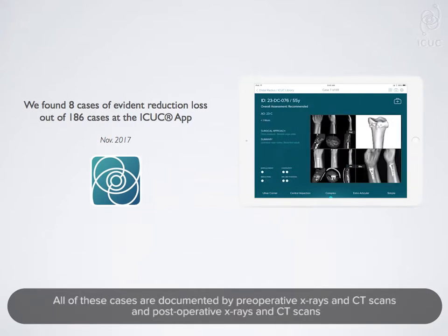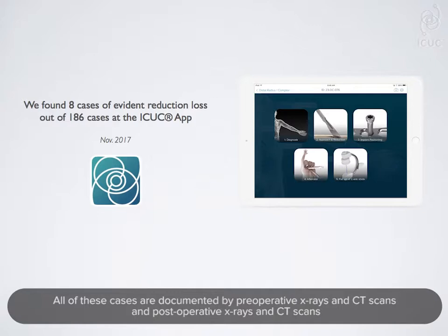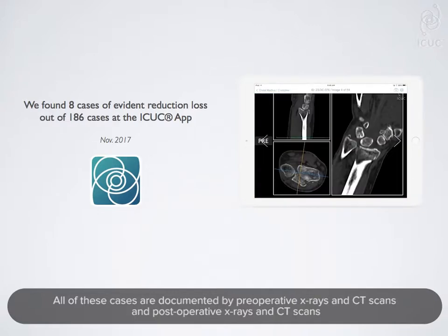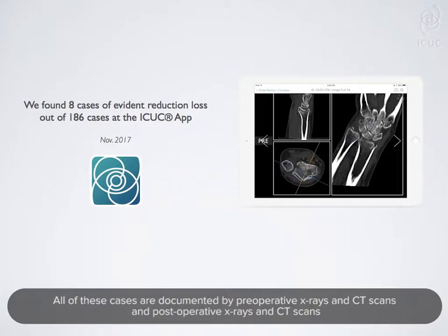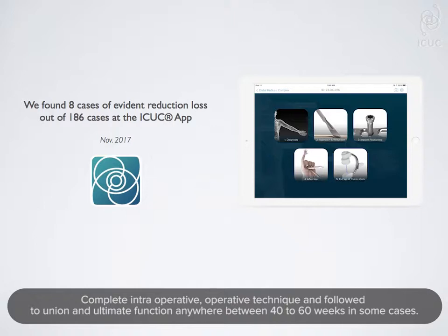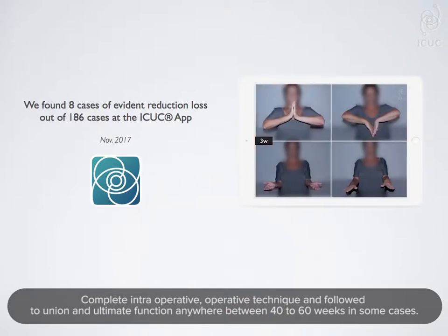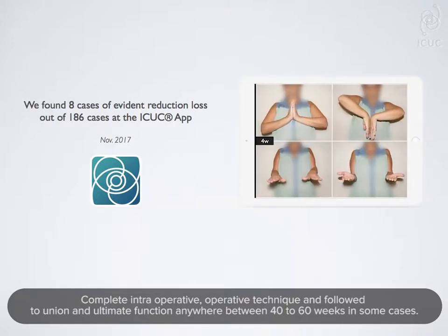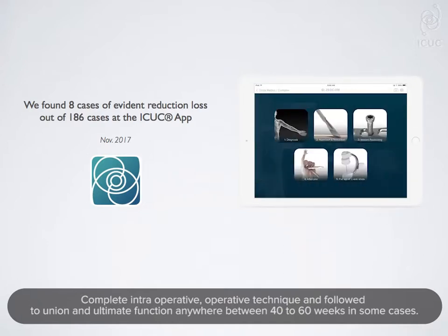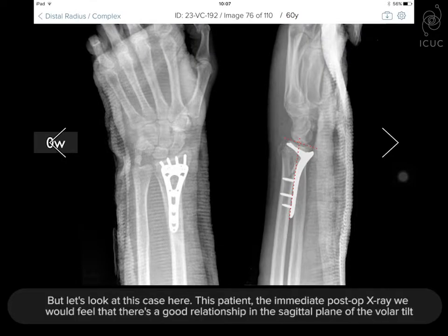All of these cases are documented by preoperative X-rays and CT scans, postoperative X-rays and CT scans, complete intraoperative operative technique, and followed to union and ultimate function anywhere between 40 to 60 weeks in some cases. So let's look at this case here.